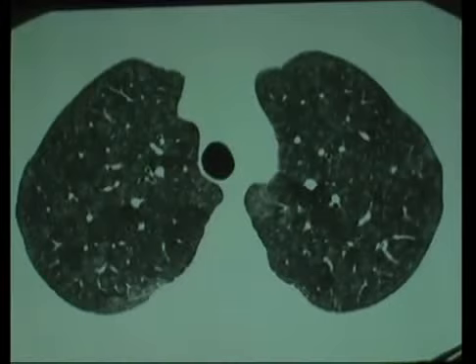So, does this look like sarcoid? Does this look like lymphangitic cancer? Does it look like IPF? Does it look like anything I've shown you up to now? No. What are we dealing with? We're dealing with poorly defined ground glass nodules everywhere, virtually everywhere. None of them along the pleural surface, none of them really along the fissure. Here's one, here's one, there are literally innumerable of these. Poorly defined ground glass nodules uniformly distributed through the lung.